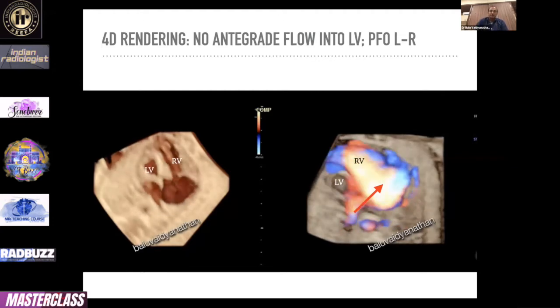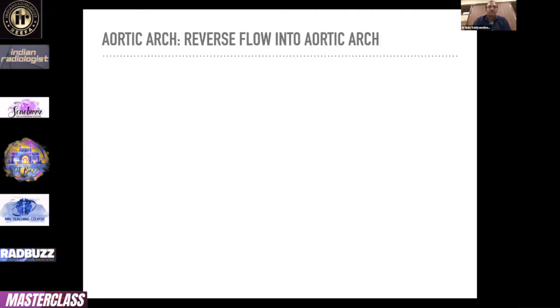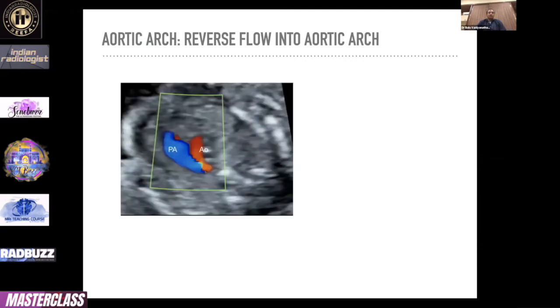That is a very, very typical feature of hypoplastic left heart syndrome. Then when we move towards the outflow tracts, and this is what we showed, and remember the normal three-vessel tracheal view, which Dr. Alpana, Mark, and I, all three of us showed. Now here, look at the three-vessel view. You see the PA and the aorta, and there's a small SVC also.